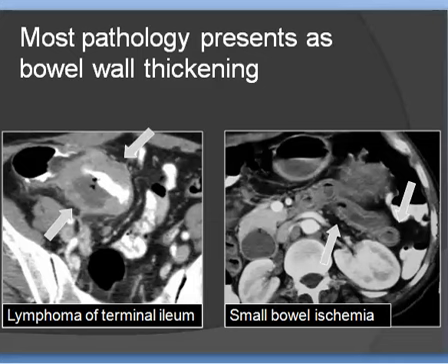So small bowel thickening is the main presentation in small intestinal loops, but of course the pattern of thickening, if it is smooth, continuous, and long segment, will be different from a short segment of mass-like effect compressing the lumen. The first, with the longest involvement, should raise the possibility of Crohn's. And if there is something acute, ischemia is a possibility, and if it is ileocecal, please look for TB, also lymphoma and Crohn's disease.